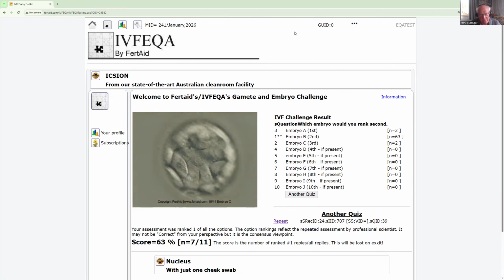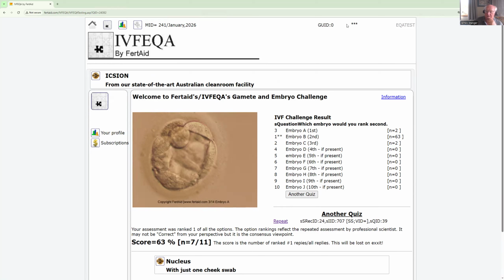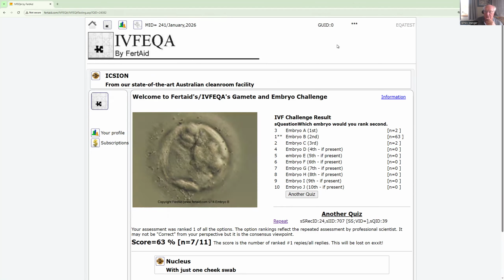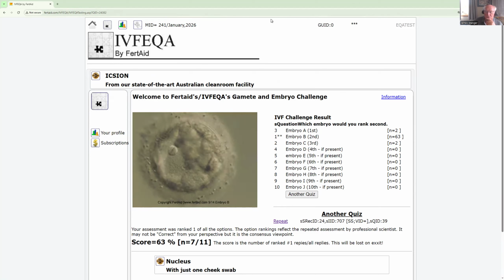Everyone will disagree with everyone else, but hopefully if you have an active embryology group, there will be discussion. And if that happens, I'll be happy. And at this point, I think I'll just call it quits, and we'll come back and do some more a bit later.